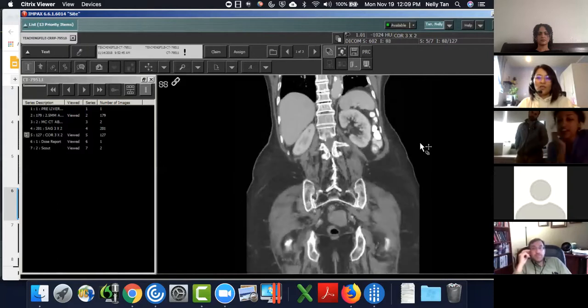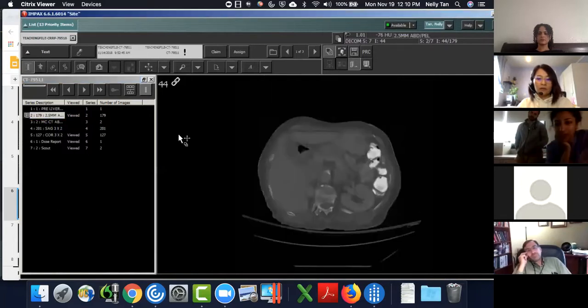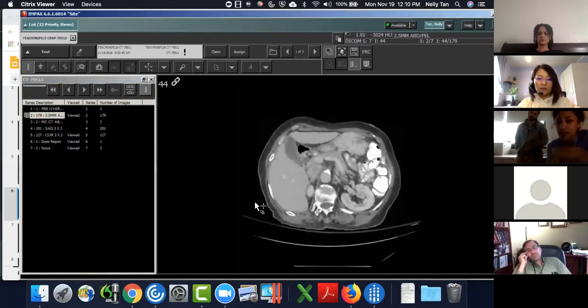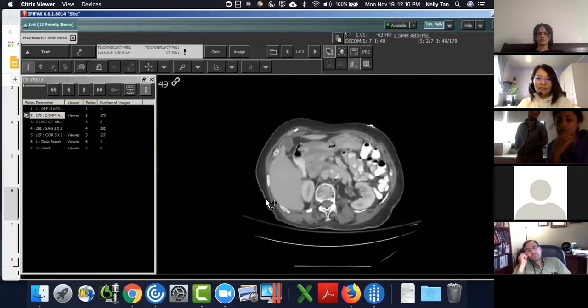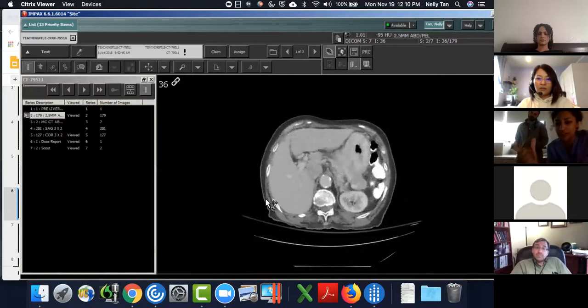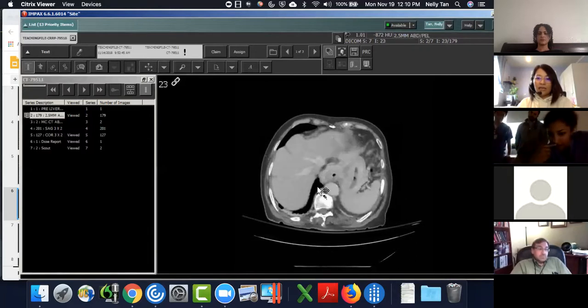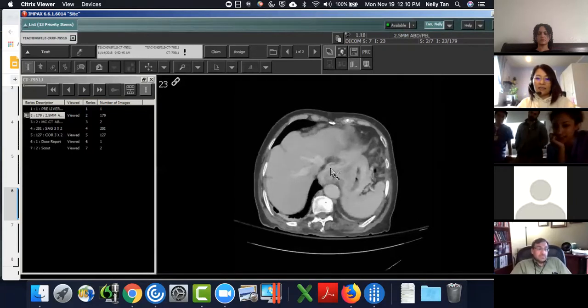Okay. So what's your opinion? Sorry, go ahead. Well, I have 2 questions. One is, you said if the epicenter, it just seems like it's also involving a lot of the stomach, but you're saying the epicenter is around the cardia/GE junction. Yeah, I guess it is centered there.